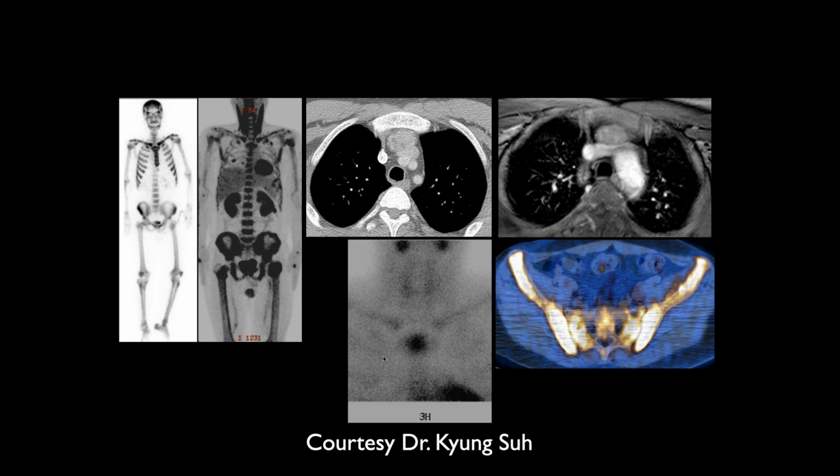Is this bright? It is kind of bright all over. The acetabulum is involved too, isn't it? Yeah, I think on the previous one there were some changes there as well, and it seems to involve all the bones.